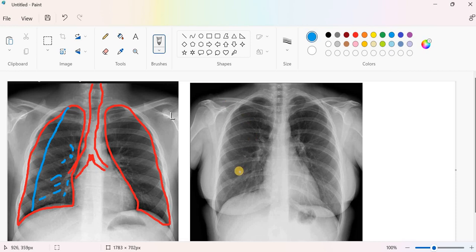You can view it on that chest x-ray also. You can see it here very apparent, very prominent near the hilum, and here slightly a little bit like lines going to the periphery. But if you came here, it is less visible. Less visible not because there is no bronchovascular marking, there is, but they are very minute to be detected by your naked eyes. Okay, so this is regarding the airway.